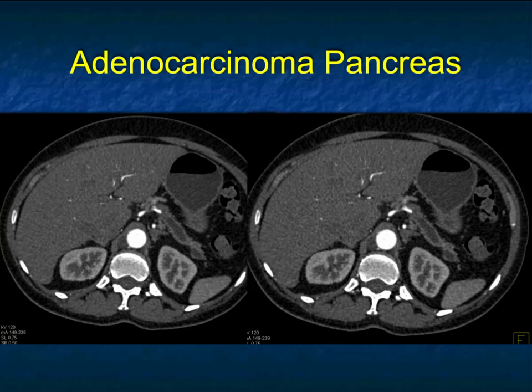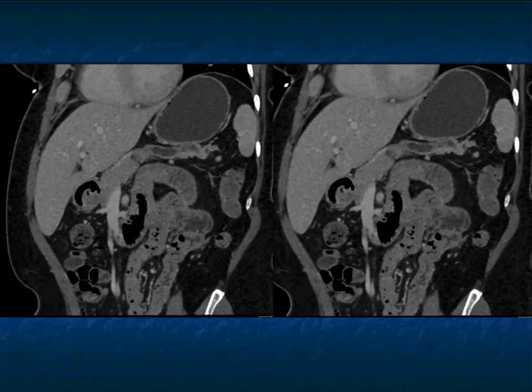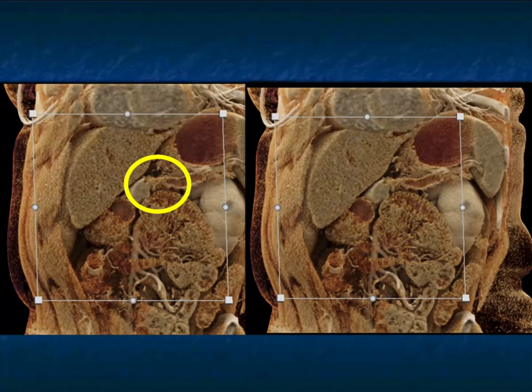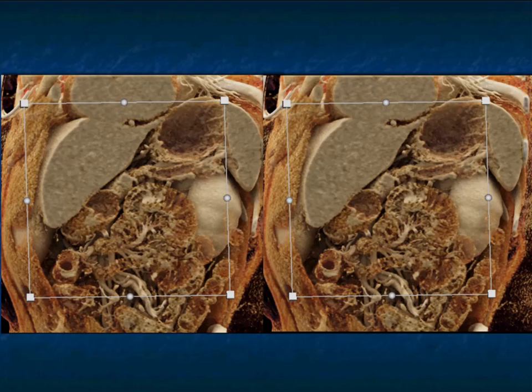Another case, markedly dilated pancreatic duct, atrophy of the gland. You don't see an obvious mass, but then when you look along the center line, this must be the mass sitting right inside the patient's pancreatic duct. And there it is, very nicely shown on the cinematic rendering. You see the loss of gland here, this textural change, and the gland is smaller, and there's the duct obstructing, and that's the patient's tumor, better appreciated on the cinematic views, nicely shown again in this example.